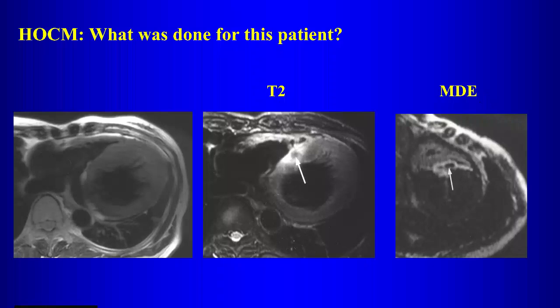Well, most of this enhances, but there's this central area that does not enhance, right? So what happened to this patient? So the patient underwent an ablation procedure, so the hyperenhancing area represents what? The enhancing area is what? Well, what's the idea with the ablation procedure? What are they doing? Killing tissue, right? They're inducing an infarction, right? So that area, this is all infarcted myocardium. What's this area that is not enhancing?